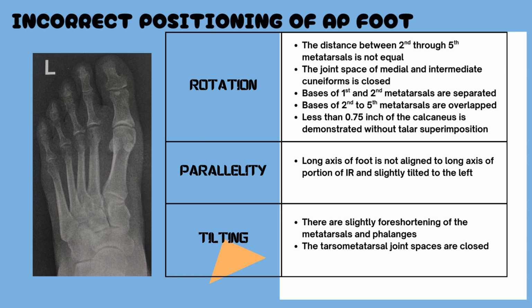The next fault is about parallelity. Based on this image, we can see the long axis of foot is not aligned to long axis of portion of IR and slightly tilted to the left.